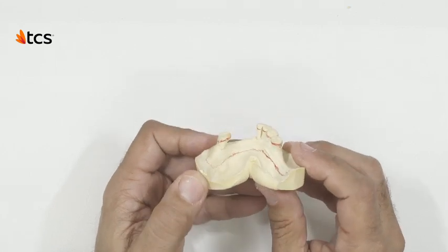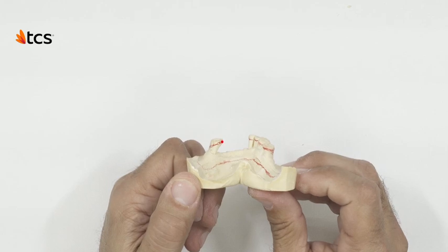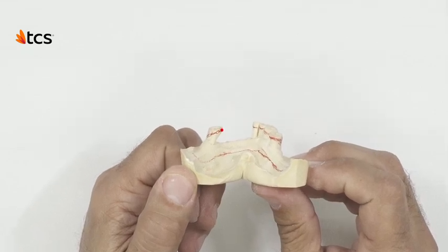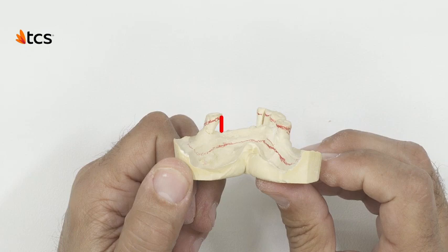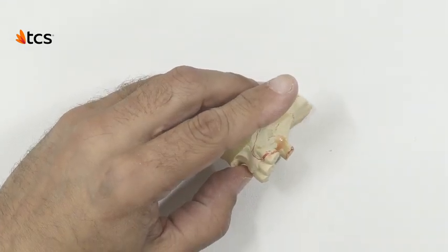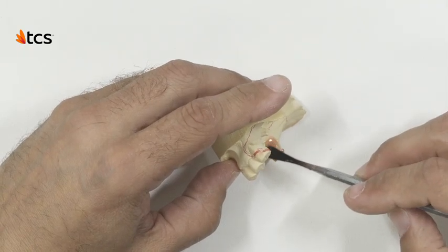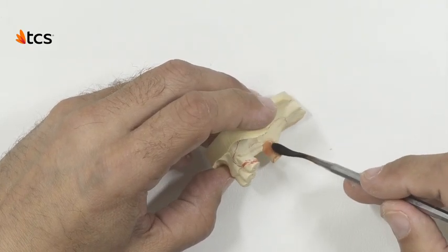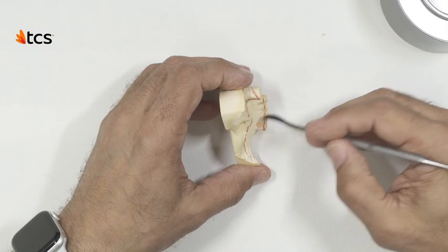The blockout for this case will determine its success. This section of the premolar requires a substantial blockout. In fact, 100% blockout lingually would be advised. Addressing the lingual undercuts on this premolar will allow a more accessible path of insertion. The undercut on the distal portion of this tooth can also be blocked out.